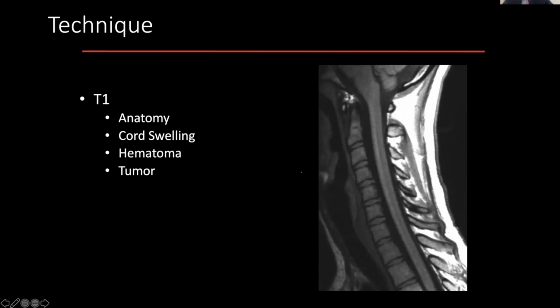But again, just the traditional MRI, T1, you've probably heard of. We pretty much use this because of its ability to show us fat, and you may have heard the term "fat is your friend." So the fat that courses between the various muscle groups, etc., allows us to see structures immediately adjacent to it.